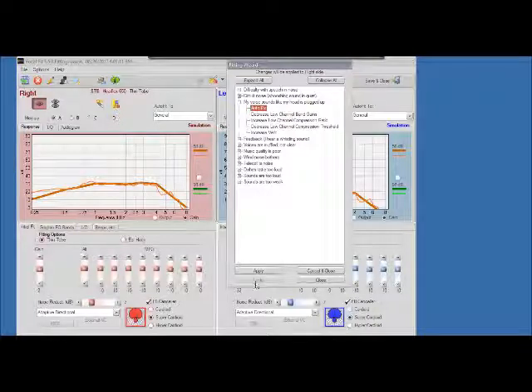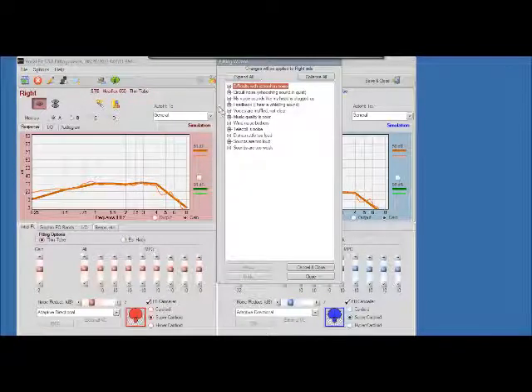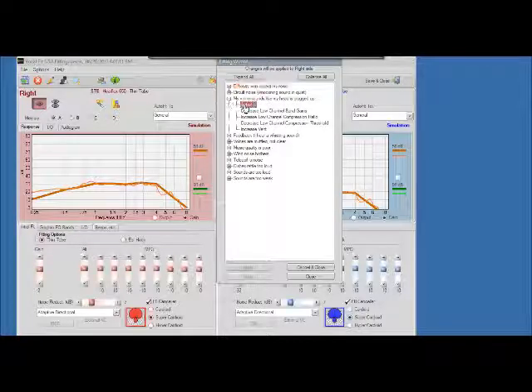When you get back to where you started, undo will unhighlight and you will not be able to click it any further. So when you're making changes in here, keep in mind not to go too far before you close it. Always ask your patient and make sure you don't have to undo, because once you close this application, when you open it again, you will not be able to undo. Even if you pick the same thing you did before, undo will not light up until you apply something again. Okay, so make sure you didn't go too far before you end.